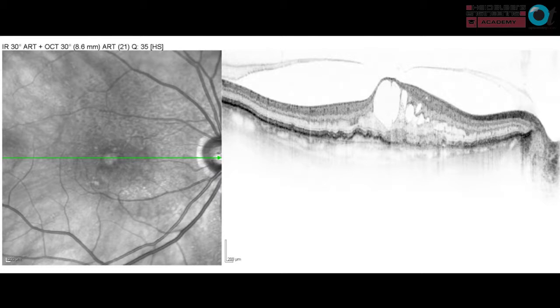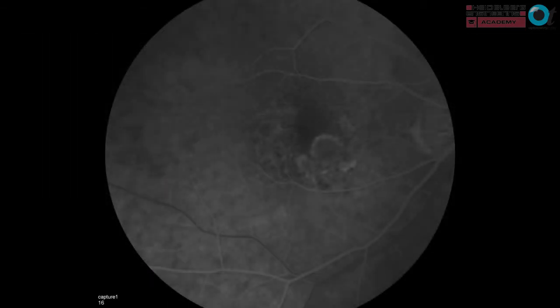But here you have an elderly gentleman with geographic atrophy in their left eye, noticing distortion in their right eye, with macular edema, with other signs suggesting AMD. You must have wet AMD at the top of your priority. That patient needs to be fast-tracked to the clinic. We saw this patient very urgently with a fluorescein angiogram, and in the earliest venous phase, you can see this choroidal neovascular network light up with the fluorescein.